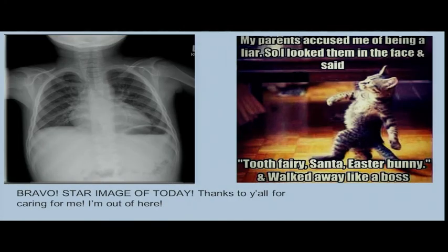All right, the same patient, and this was the chest X-ray after treatment. And this image actually makes me smile every time I look at it. The baby did well, the kid did well, and he was discharged. On a lighter note, I saw this image because I could just imagine this kid walking away and feeling so proud. Yeah, my doctors did it. I saw this image, which made me laugh as well.